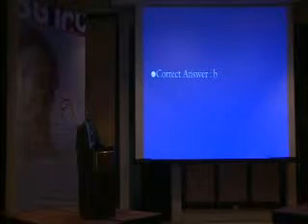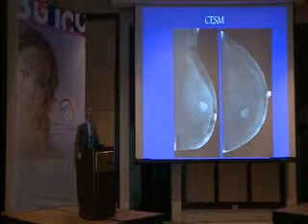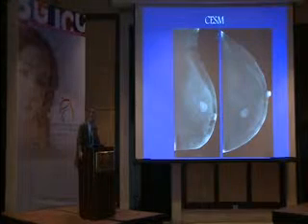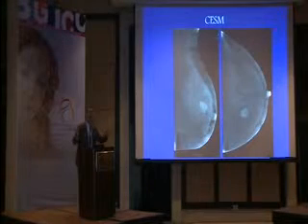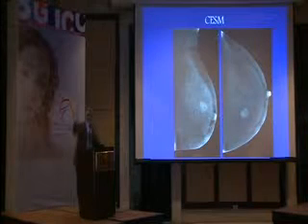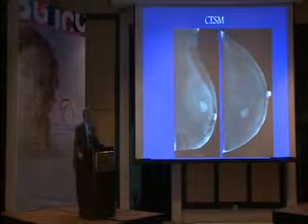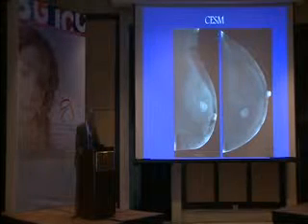But we had a clever radiologist who did this case, and that's how exquisite is the contrast spectral mammography. Just wow, you don't need any skills. It's just a tumor that is saying, hi, I'm there. So it's not a big deal there. So this is the second case.